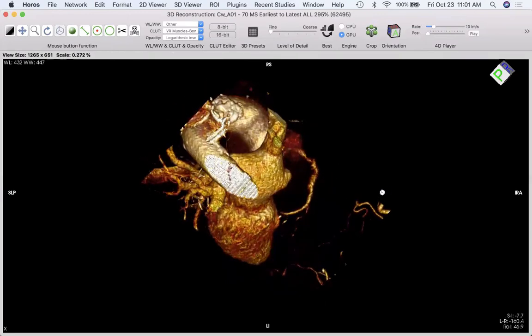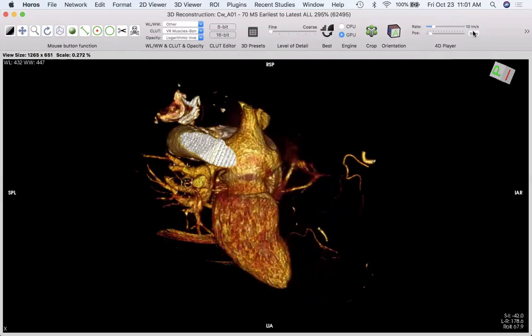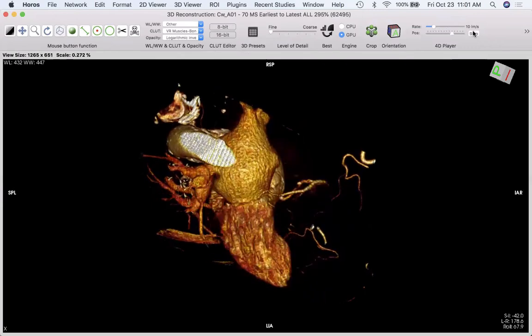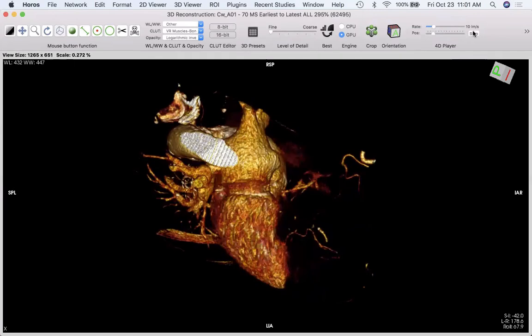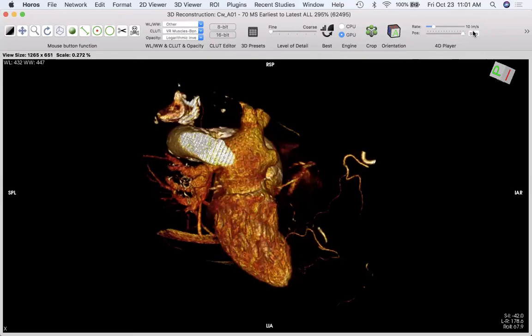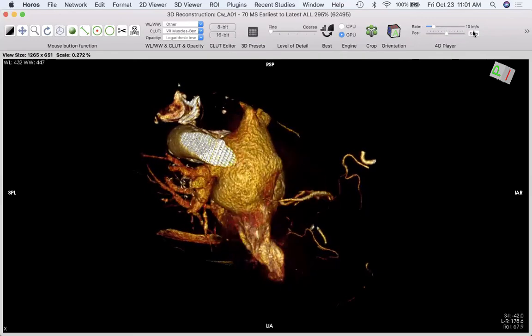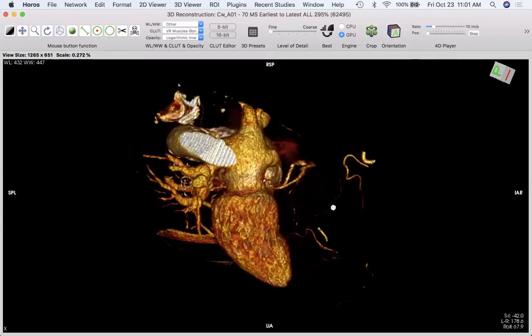But now one of the interesting things is now that you've got this, you can also watch a movie, see how it moves over time. And you can see there are two main times at which this artery looks like it's almost stationary. One is there at end systole, and one is there at end diastole. And the other positions, it seems like the artery is in motion and the images get kind of blurry, right, because of the motion artifact.